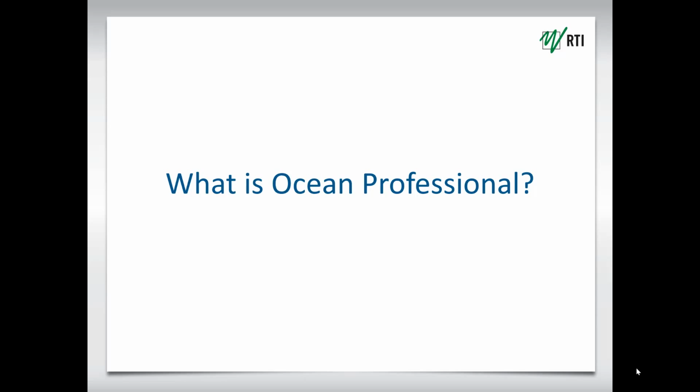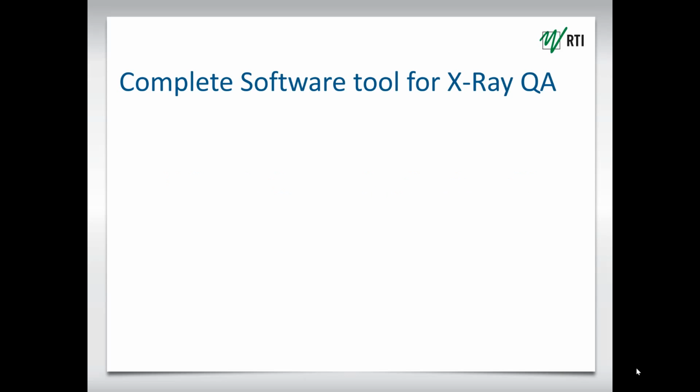To start with, I would like to answer a few questions you may have about Ocean Professional. What is Ocean Professional? Ocean Professional is a complete, powerful, and flexible software tool for obtaining, analyzing, storing, and reporting of your diagnostic X-ray QA measurements through customizable templates.